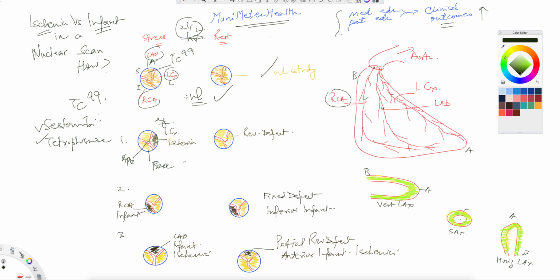But it's very interesting because nuclear cardiology is a full 2-year course. We're trying to give you small snippets here between the videos, just so that you understand exactly how to make an interpretation of a reversible defect. Now we're talking about a reversible defect in a left circ lesion that reverses fully here. You see that the yellow or the orange came back within the circ distribution. Here it was dark. It came back here, so it's called a reversible defect. That means you had left circumflex ischemia only. So that's the good news, and this patient can go for PCI or PTCA.